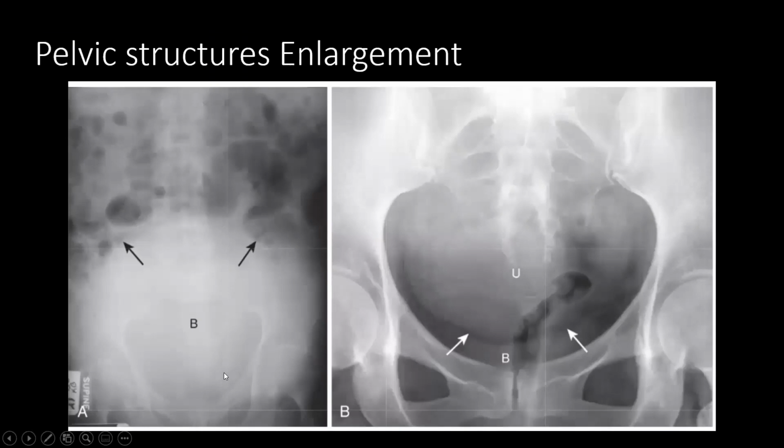When we move on to the pelvic structures, I want to point out two important things. The first one is that this picture is in a male, and this picture is in a female. This is what we talked about yesterday, which is this line of fat that is surrounding the bladder. Now, how do I distinguish the bladder from the uterus? This is the uterus above it. These are two soft tissue densities, but because of this fat, I can distinguish between the borders of both of them.